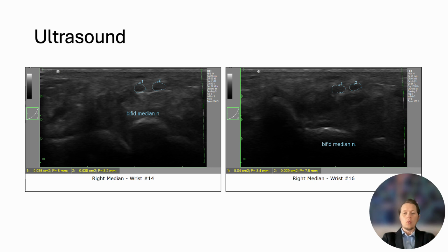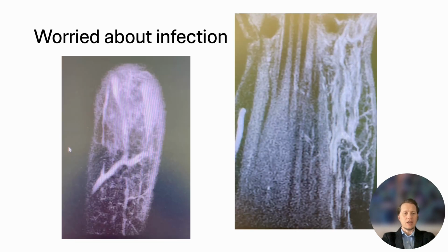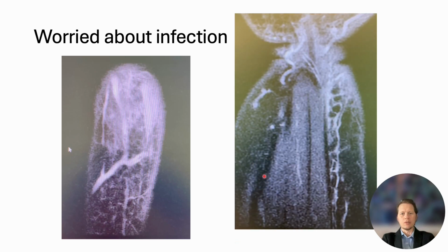Now, they were worried about persistent infection quite a bit, to the point that they decided to get an MRI. And why did they not get other values like labs, ESR, CRP, and whatnot? Well, they did, but for the purpose of this case in orthopedics, PM&R, EMG, we're going to focus on the imaging. So let's see if I can, there it goes.